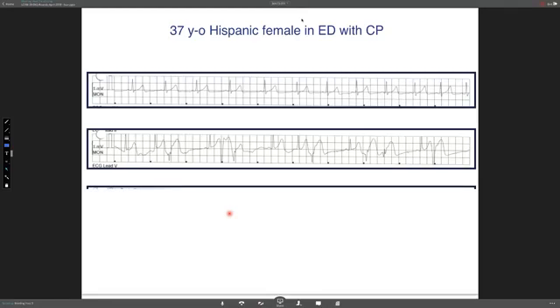This is about the beta blockers. In regards to the PVCs, I think these PVCs are not your normal outflow tract PVCs or those PVCs you're going to chase later on, for several reasons. Number one, I just brought the EKG back to the monitor. These PVCs, to me, look like ischemia related because the location and the coupling interval are quite variable.